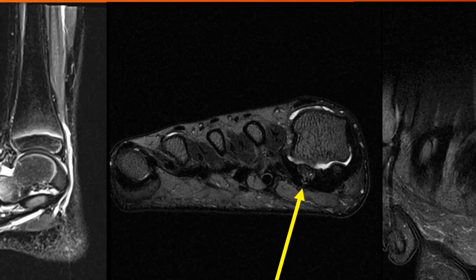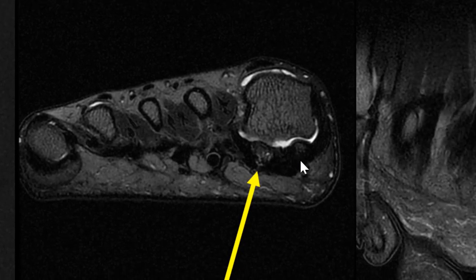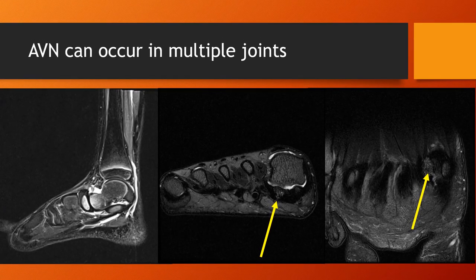MRI was definitely needed in this case. And over here, an ultrasound was performed on this hallux for pain under the sesamoids, or sesamoiditis. The sesamoid bone on ultrasound looked sort of porous and irregular, almost like tiny little pits were in the cortical surface of the bone. On the MRI, the medial sesamoid, as compared to the lateral, shows a high signal, and this is consistent with AVN of the sesamoid bone. That was in a type 1 diabetic woman in her 20s.